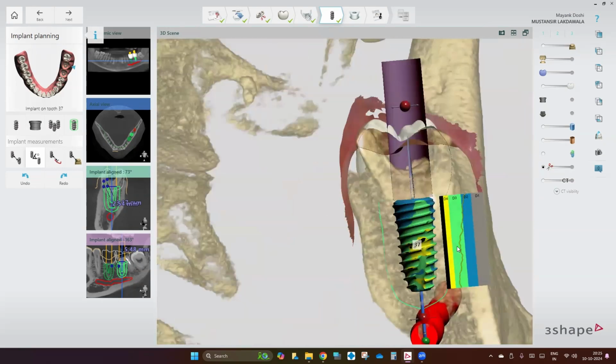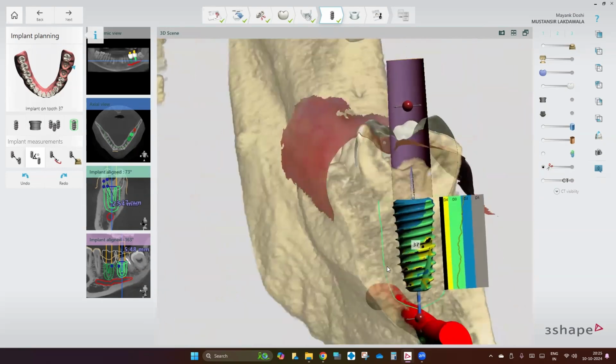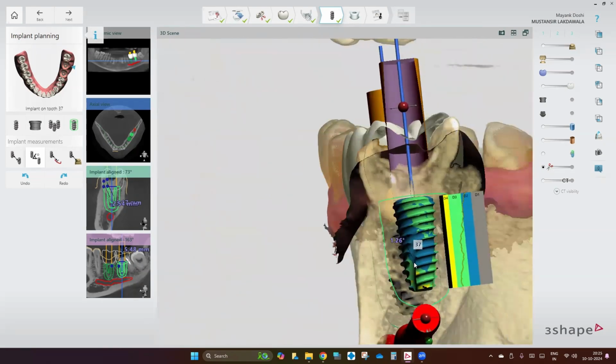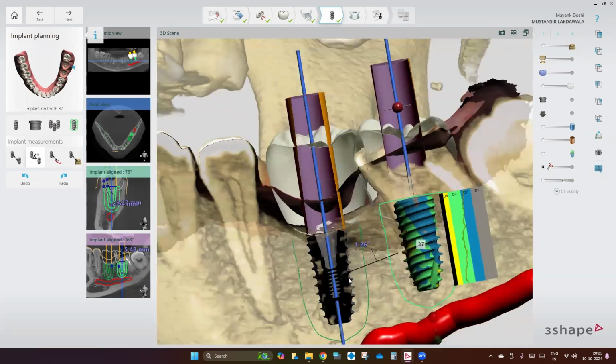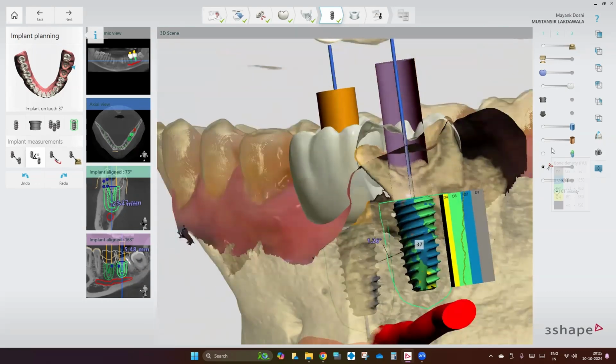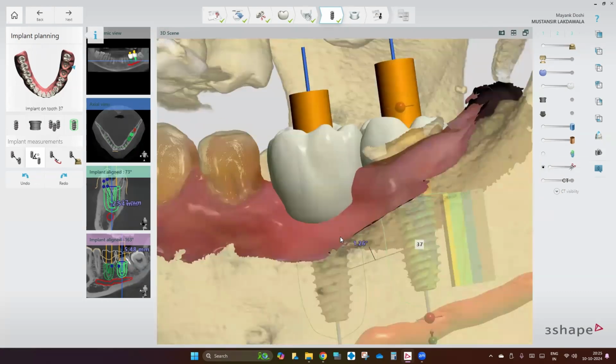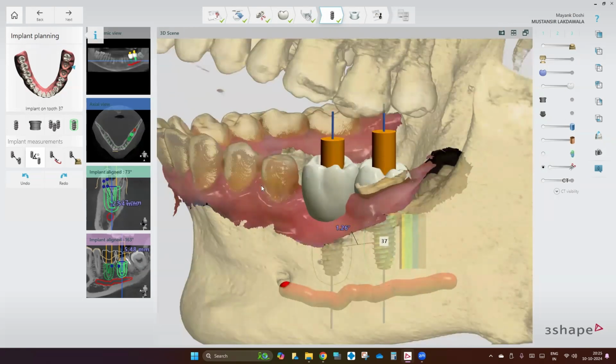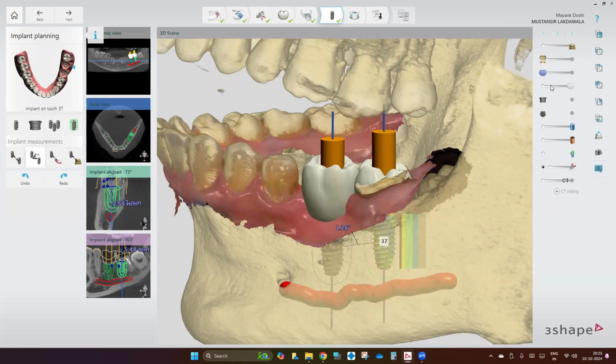See, right now it's showing in real time as and when I rotate it, that what kind of bone is going to be around my implant. That's one thing, but I will also show you guys कि वो कहाँ गया. Where you can actually measure the Hounsfield unit also. और या तो उसको कट सेक्शन पे जाता है ना, उधर के उधर ही दिखाने लग जाता है वो.